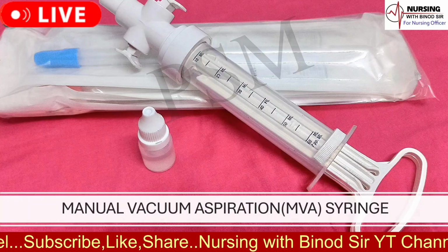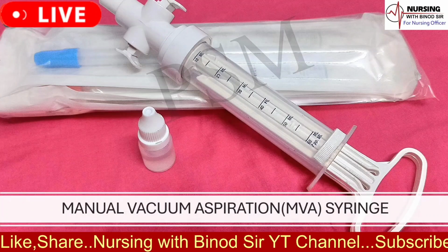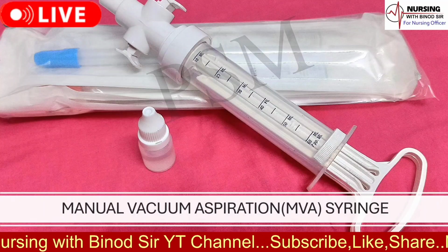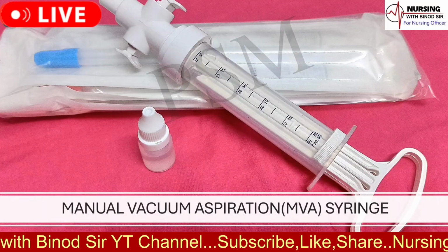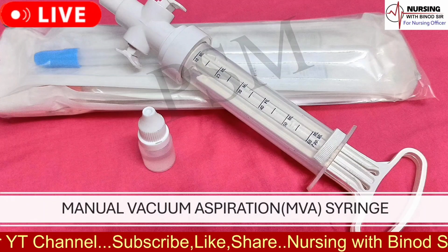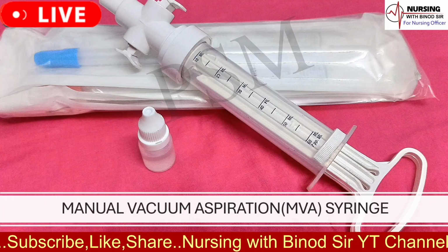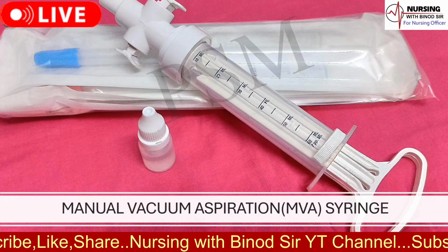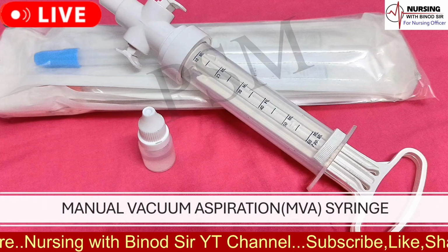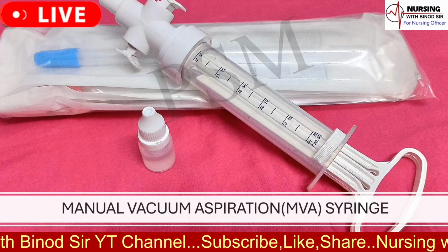4. Uterine biopsies, the syringe helps in obtaining endometrial biopsy samples for diagnosing abnormal uterine conditions. 5. Evacuation of retained products of conception, helps clear the uterus of any retained products after miscarriage or birth. 6. Treatment of post-abortion complications, MVA addresses complications like excessive bleeding or incomplete evacuation. 7. Diagnostic procedures, it is sometimes used for diagnostic purposes, such as in cases of unexplained irregular bleeding.